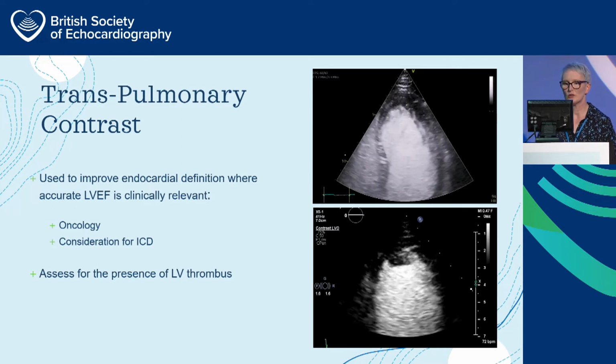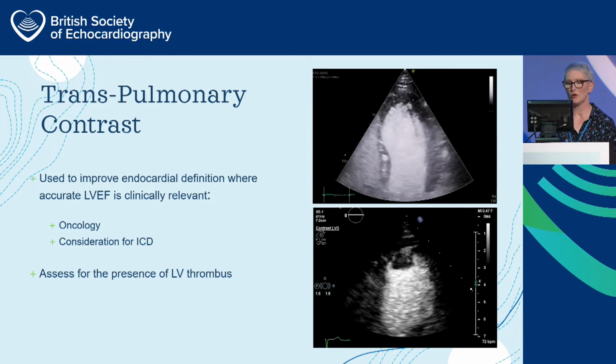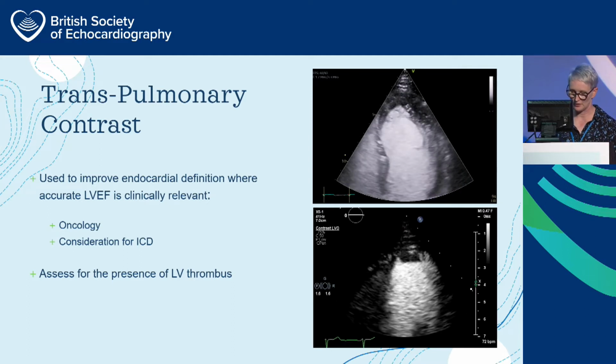The other thing just to note that you can use contrast for is to rule in or out the presence of thrombus, which you can see quite nicely in the apex on the bottom slide.